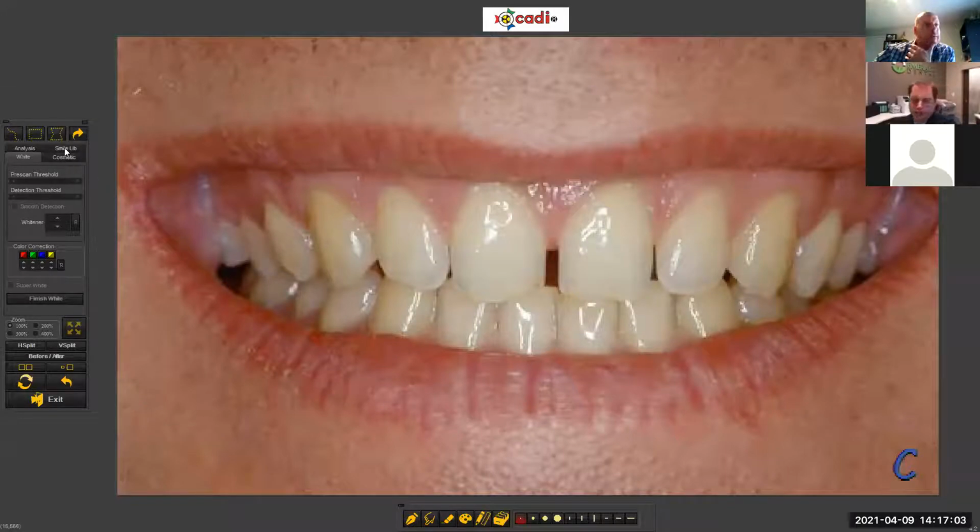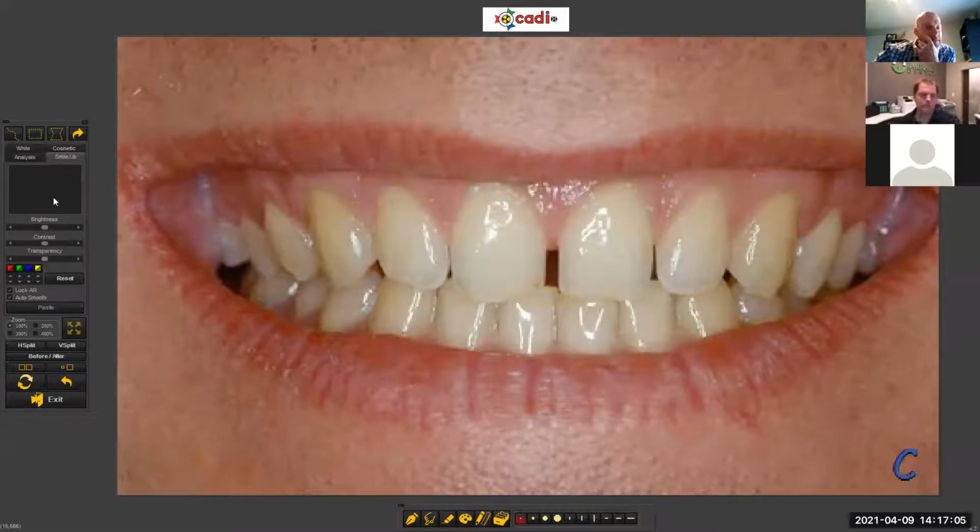You can put a little cutout region, and you could have a drop-in region. Yeah, so obviously it's not a pure stock library simulation, but I get what you're saying. I have it, I just don't have it loaded here.